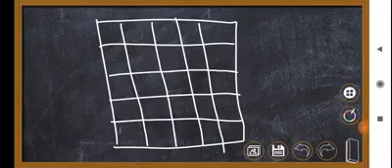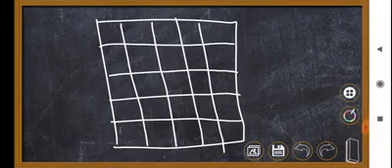Bismillahirrahmanirrahim. In this video I am going to discuss the measurements of small scales and large scales of the ECG.